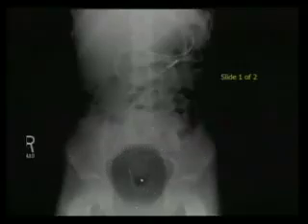This is the rectum. So what is this gas in? The bladder. And what are these little black circles? The same thing as if they were in the wall of the bowel. This is pneumatosis of the bladder. So emphysematous cystitis. Are these patients deathly sick? They're not deathly sick, no. Diabetes, but not deathly sick.